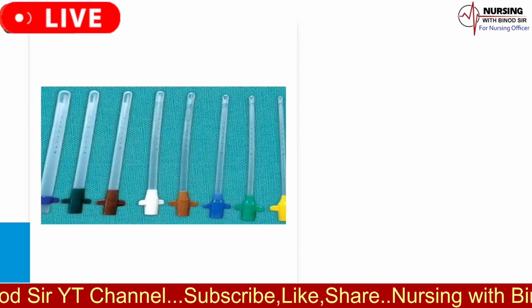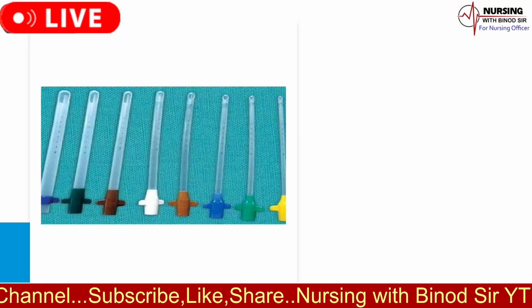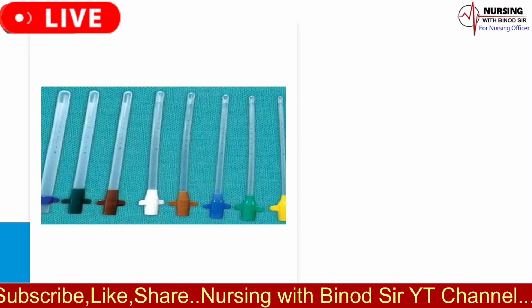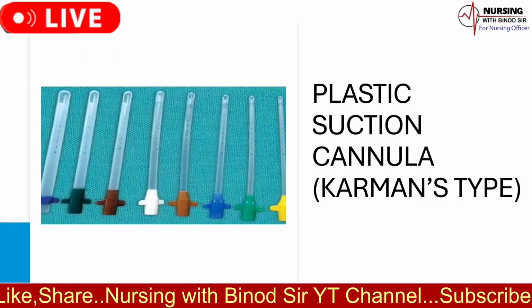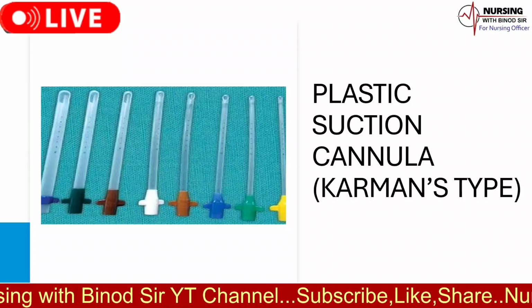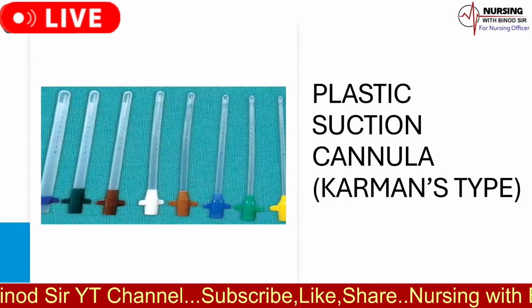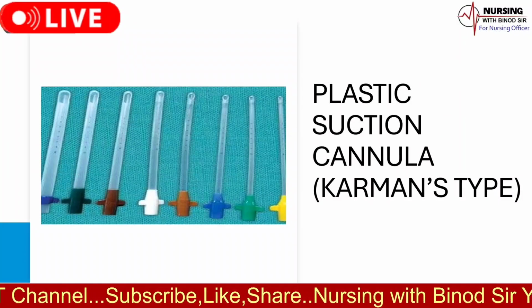The name of the instrument is plastic suction cannula. The uses of plastic suction cannula is as follows. 1. Suction and evacuation, used for the evacuation of abnormal fetuses and for addressing instances of miscarriage or spontaneous abortion. 2. Manual vacuum aspiration, MVA utilized during the first trimester for safe surgical abortions.